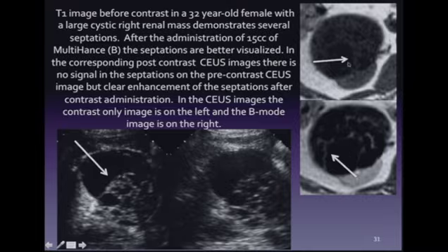This is a case with MR. You can see that this is the pre-contrast MR and this is the post-contrast MR. Here's the portion of the normal kidney. And on the without contrast, we have a little bit of signal, which we felt was probably noise. After we give contrast, we can see some additional enhancement or increased linear signals, but it's often very difficult to determine if this is secondary to patient motion or could be noise.